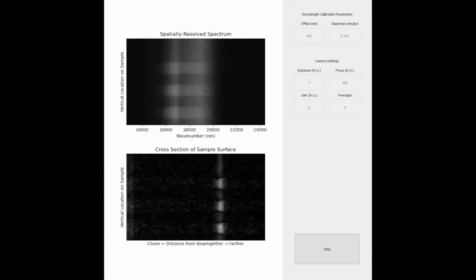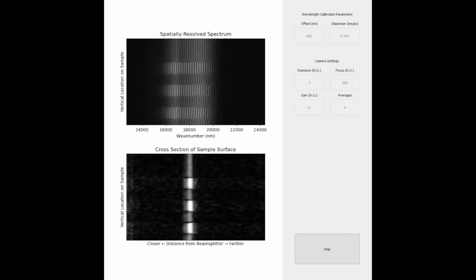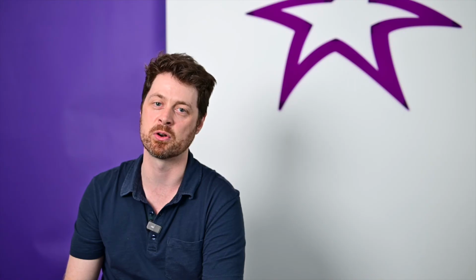In this configuration, the setup is analogous to a line field spectral domain OCT, which gives depth profiles from a line of adjacent points simultaneously to generate cross-sectional images of tissue. Commercial OCTs attain much higher sensitivities and spatial resolutions than the demonstrative, low-cost setup shown in this video.